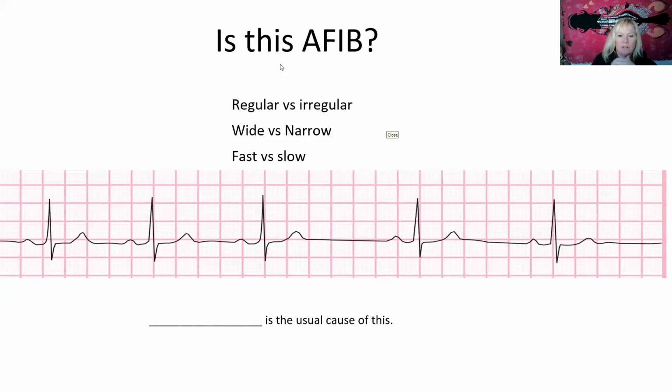Hillary, good question, good thought. I'm going to come back to that. But a lot of folks are saying, no, this is not AFib. And TC, you actually got it right. This is a sinus arrhythmia. Same with you, Tanya, and Komal, good job. The question is, is it AFib? It's not, and here's how we know: we do have discrete P waves. They are there. You can definitely see them.